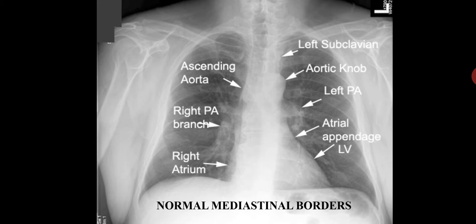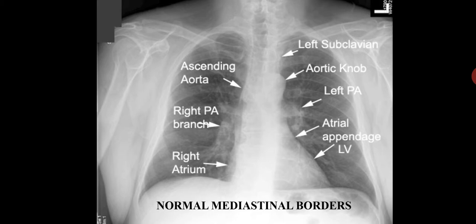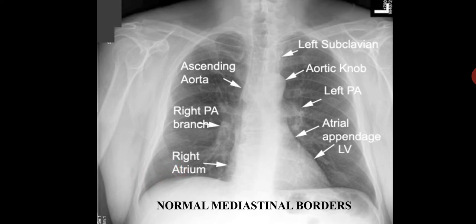This is the cardiophrenic angle. It should be clear, and this is the costophrenic angle.